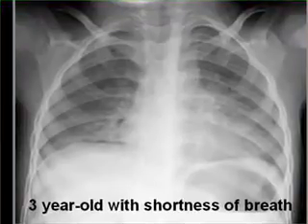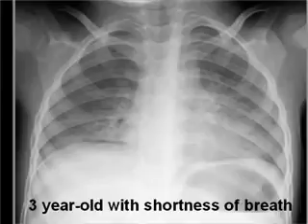But this is a 3-year-old with shortness of breath. Look at the image and determine what you think. You can pause your computer or MP3 player for each of these cases.